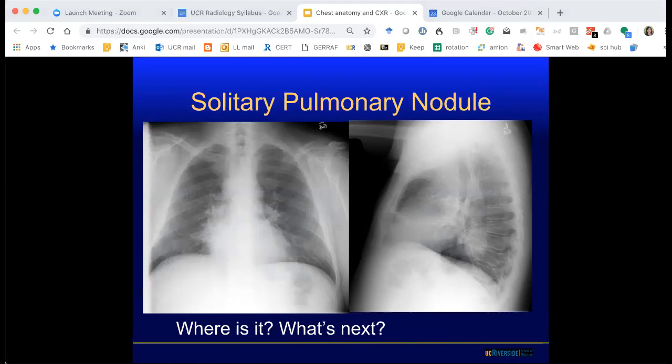What is the gray area by the left lingula area? What is the gray area by the left? This one? That's just normal lungs. It's the breast shadow. So you can see it symmetrically here. This is the breast. Sometimes you can see a nodule there, and that's the nipple. The first one you pointed to? This one? Yes. So this one is probably part of the pulmonary. So this is the left main bronchus, this lucent area. So this is probably the main pulmonary artery that's coming down, up and down.